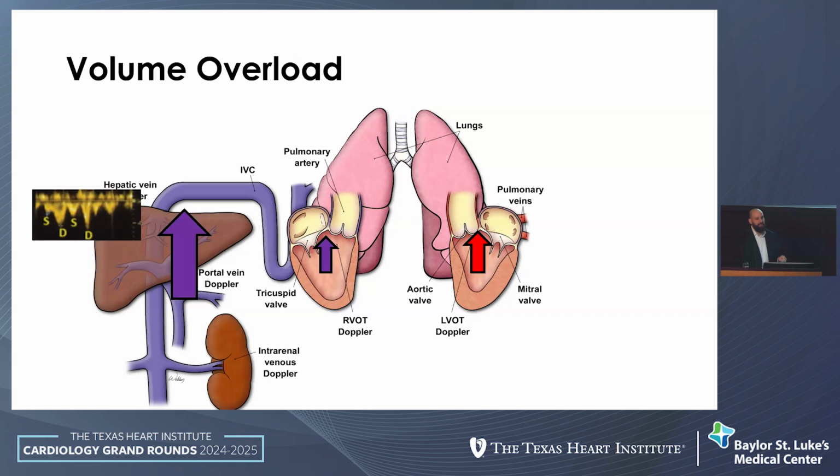But remember, the hepatic veins will never reverse in patients who have normal tricuspid valves. It can be abnormal and blunted, but never reverses. The key discerning parameter here is the portal vein. You notice that this patient who got 10 liters now has pulsatile flow. If you had a swan, you'd have not so elevated filling pressures, but you have evidence of organ congestion. The right answer would be to diurese, and your swan may lead you astray.